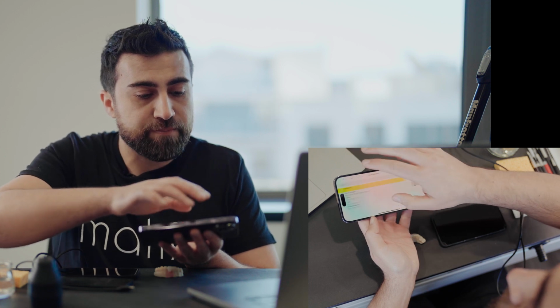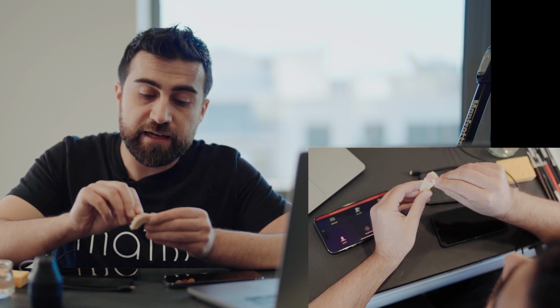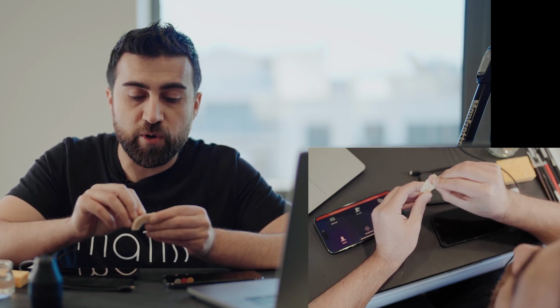The next step in the process is to make a photo of the full monolithic crown on the aesthetic model with Optishade. When using the Matisse Staining Studio, it's important to always replicate the aesthetic model, because it's important to see how much the color of the preparation is influencing the crown. So always put some glaze liquid inside, and then place it back on the aesthetic model. We also made a specific video on how to make the aesthetic model. You can see it on YouTube as well.